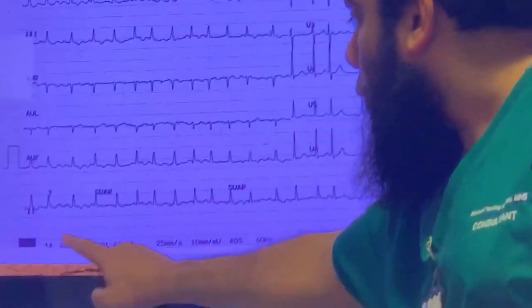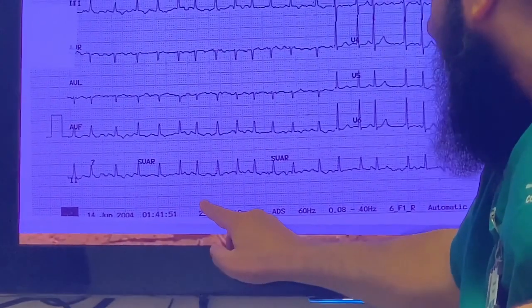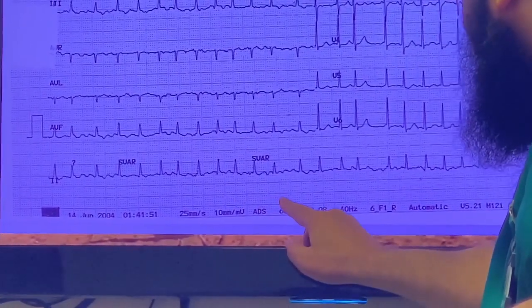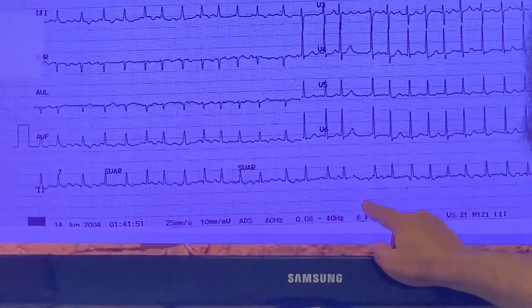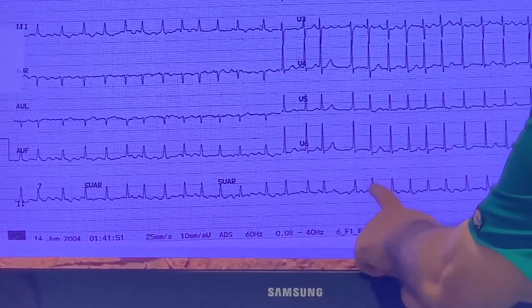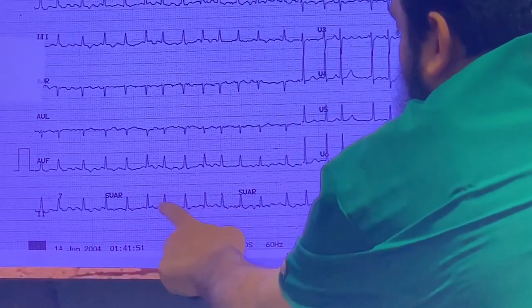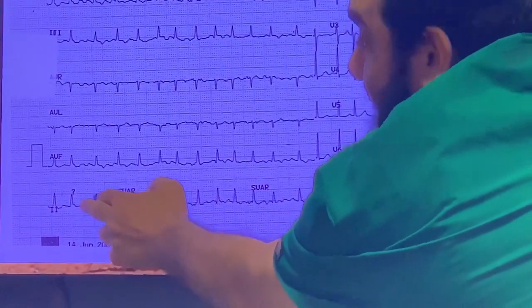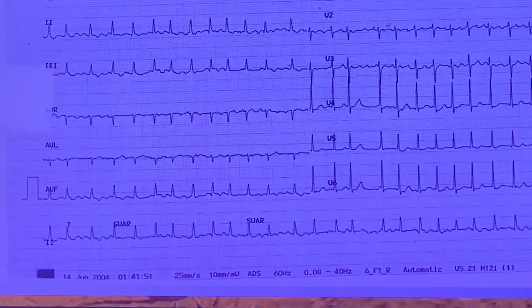So 1, 2, 3, 4, 5, 6, 7, 8, 9, 10, 11, 12, 13, 14, 15, 16, 17, 18, 19, 20, 21, 22, 23, 24, 25, 26, 27, 28, 29, 30. Here, how many R's? 1, 2, 3, 4, 5, 6, 7, 8, 9, 10, 11, 12, 13, 14, 15, 16. 16. Okay? So 16 by 10 is 160.